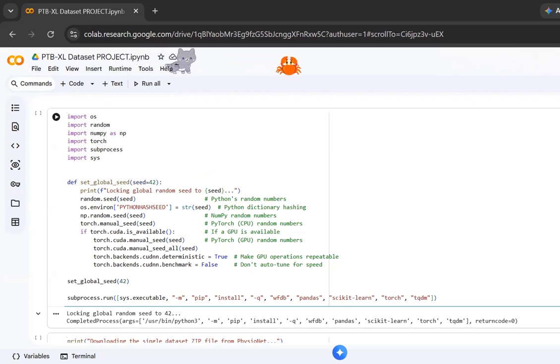In this demo, we'll be walking you through our PTB-XL ECG project directly from our notebook. We'll show you how we prepare the dataset, train a baseline 1D CNN, and then audit intersectional fairness across age and sex on the unseen test set.